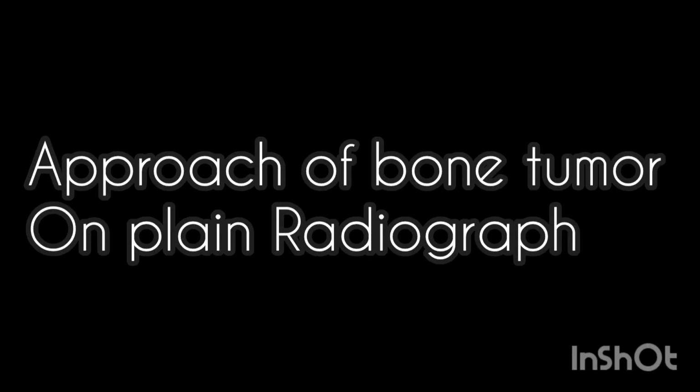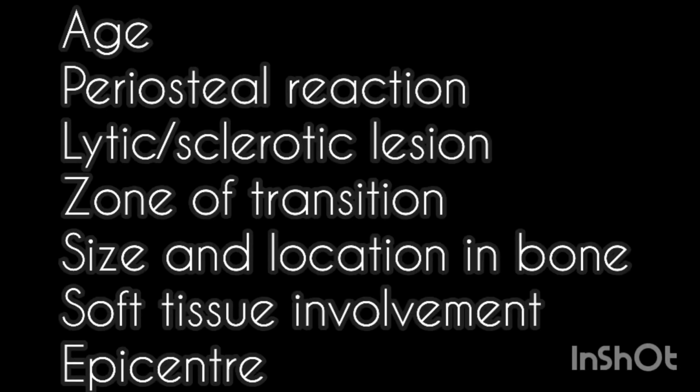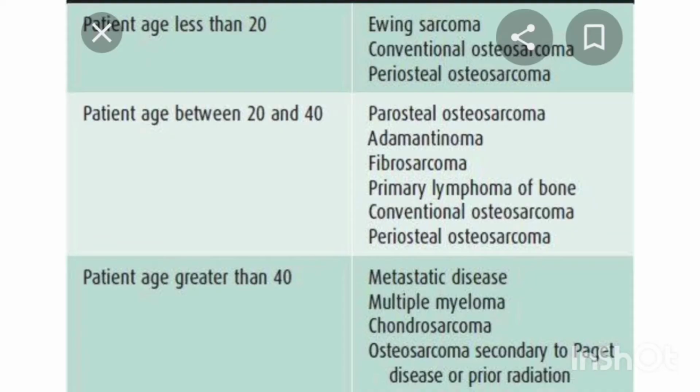Approach of bone tumor on plain radiograph. We have to look for the age, periosteal reaction, lytic and sclerotic lesion, zone of transition, size and location in the bone, soft tissue involvement, and the epicenter.